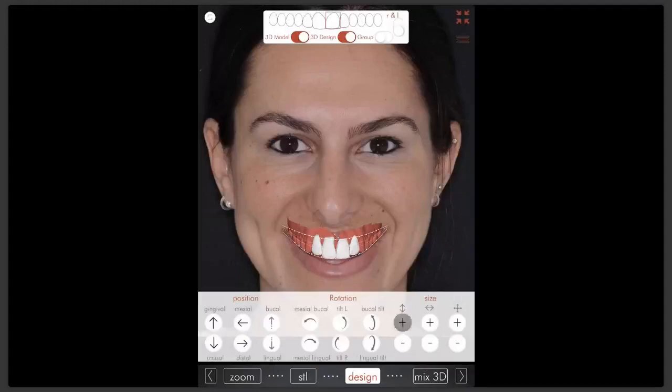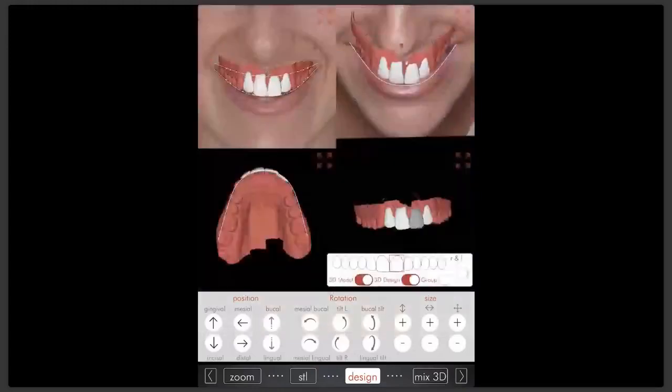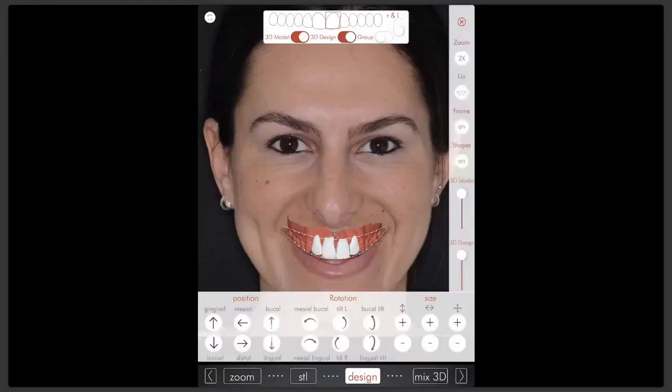Okay. So once I think I'm okay, I'm matching the design and the frame I did, I'm going to click on the top again. Can you see all of those arrows in a square format? I zoom in. Also here at the menu, something I wanted to share with you. If you click on these 3 lines below the 4 arrows on the top, it's a menu. So I can play with the opacity of the 3D model. I can play with the opacity of the design.